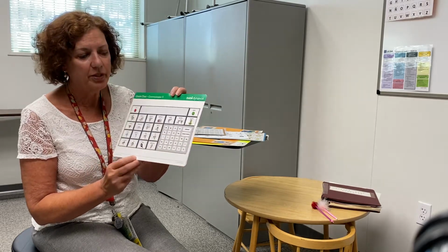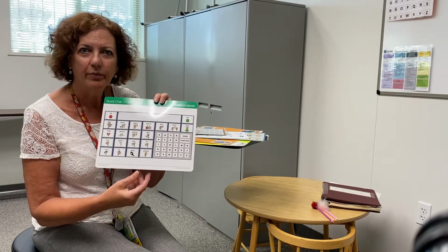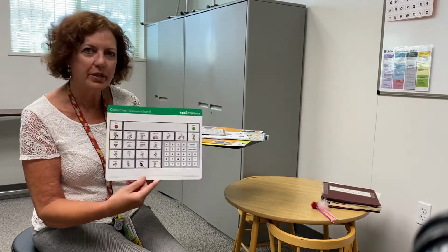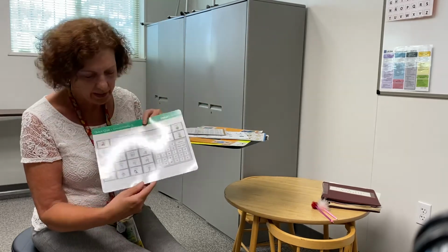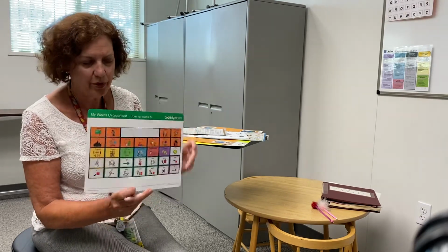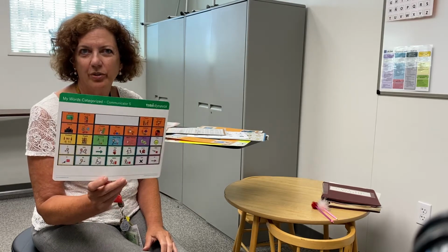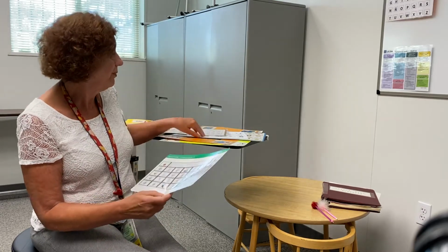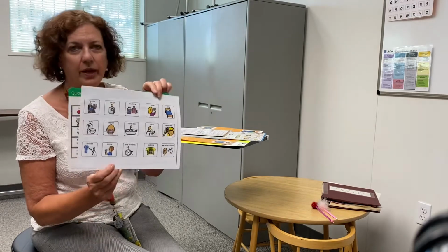And if the person is able to use their hands or a pointer, something, they can communicate with nursing as well as you with a simple communication board. So this one has line drawings and a little alphabet. In the AT world, the different ways that symbols are described are photographs, line drawings and symbols. So this would be more like symbols.